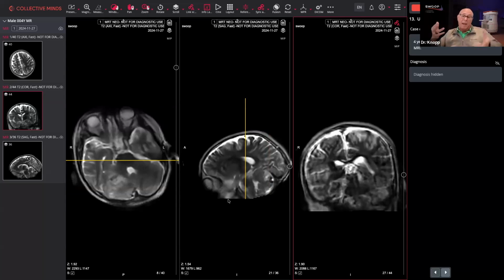And all we have is T2 weighted imaging, so it becomes a little difficult to make a definitive radiologic diagnosis from this. And could this cause the headache? I think any form of intracranial mass effect could cause headache. The signal change does extend to the superficial surface, and obviously the brain parenchyma doesn't have nerve endings to cause headache, but the meninges and coating surfaces, be it pia arachnoid, can do that. So I think headache could be caused by this.